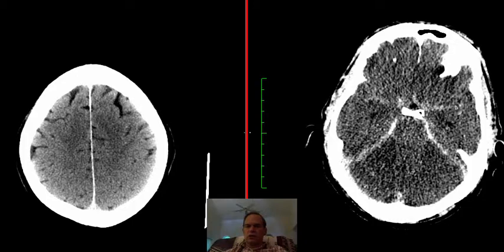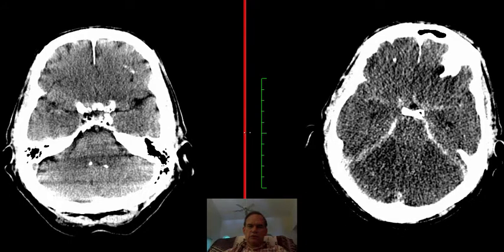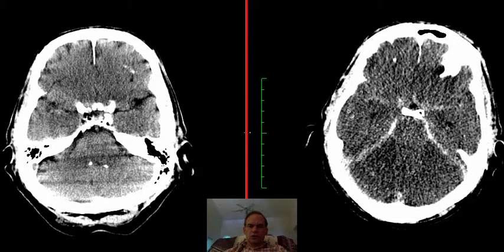Now, this high attenuation here in the region of the middle cerebral arteries looks quite different than it did here, and that is because it looks almost like subarachnoid hemorrhage, and that's because you have high attenuation blood vessel in this region, and what's immediately adjacent to it is this ischemic edematous brain, which provides a contrast of normal vascular relative high attenuation from the low attenuation brain that is anoxic injury.